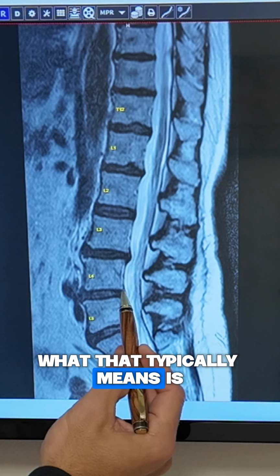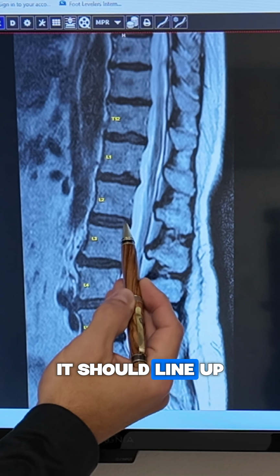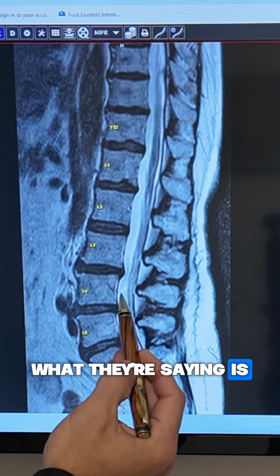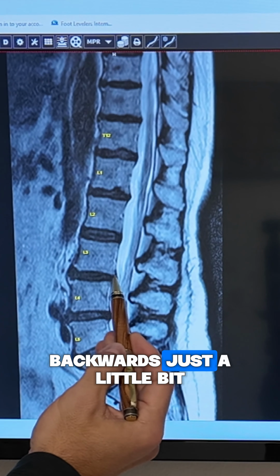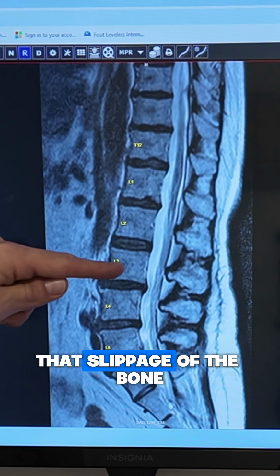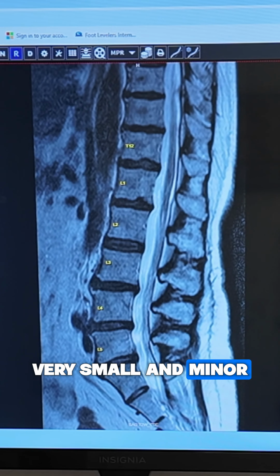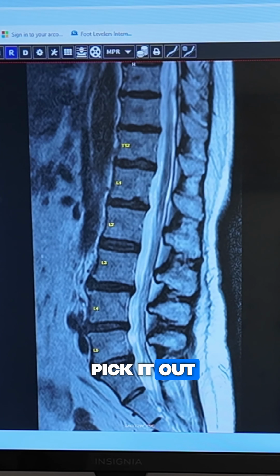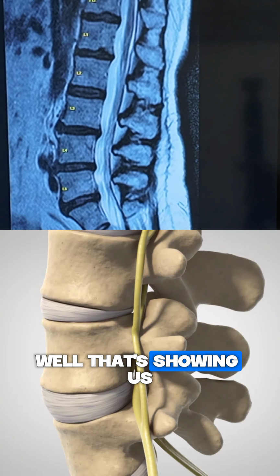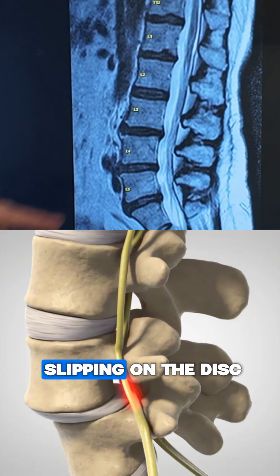What that typically means is if you line up the back of L4 and you keep going, it should line up all the way. What they're saying is L3 actually shoots backwards just a little bit, and it's creating a retrolisthesis. That slippage of the bone is going back into the spinal cord a little bit. It's very, very small and minor, but the radiologist did pick it out. Now, why is that a big deal? Well, that's showing us that that's starting to become an unstable joint because the bone is slipping on the disc.